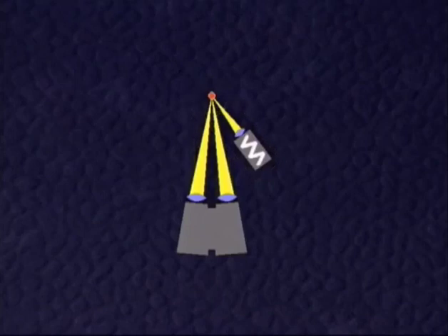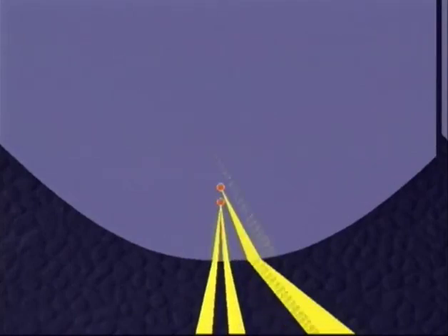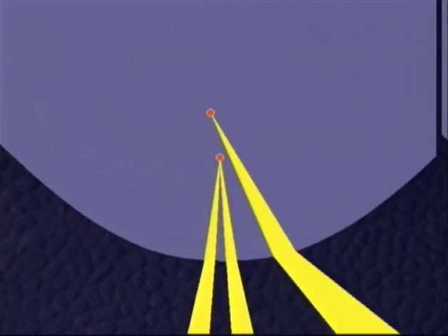However, foci, as set by the construction of the slit lamp, coincide only in an air medium. If the rays from the microscope and slit beam enter the eye, the optical pathways to the target may become unequal, and the present coincidence of focus is lost. The optical section is then no longer sharp.